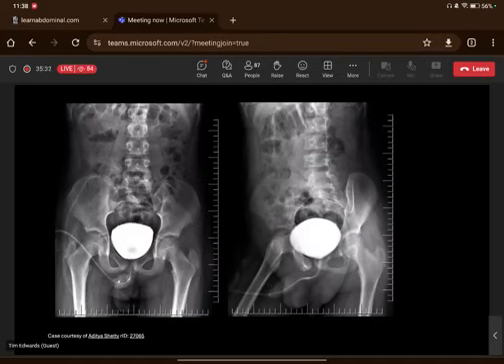And then when this has happened, they have the catheter removed, and then fluoroscopic images are taken of them voiding, and that can not only show the bladder, but it can also show the urethra as well. And we'll talk through the urethra a bit more in the next section.